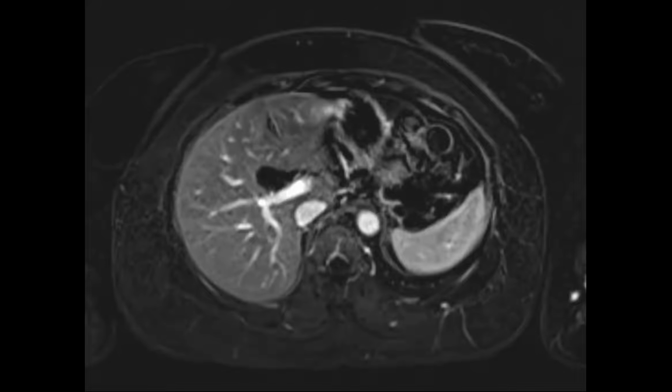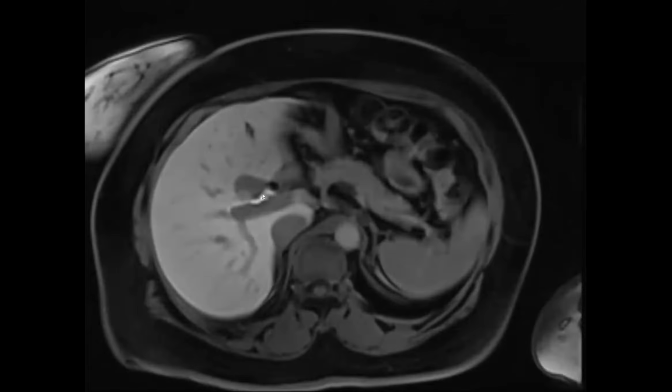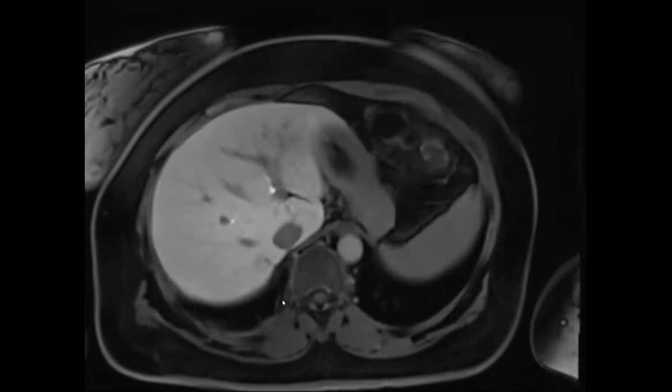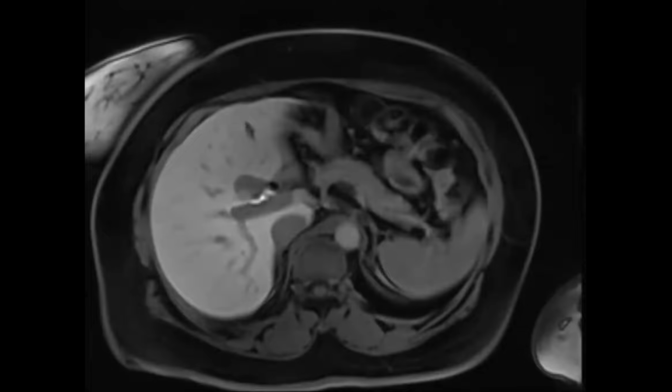Or it could just be a cyst, right? Like a hematoma with a little complex debris in it. Anyway, we recommended an EOVIST scan to see, is it a choledochal cyst? Could it communicate? This is the EOVIST here. Nice biliary excretion. Nothing was in the lesion. This T1 bright stuff was the same little nodule. So it wasn't communicating, but they decided to resect it because they were concerned about a choledochal cyst. And the final path came back ciliated foregut cyst.